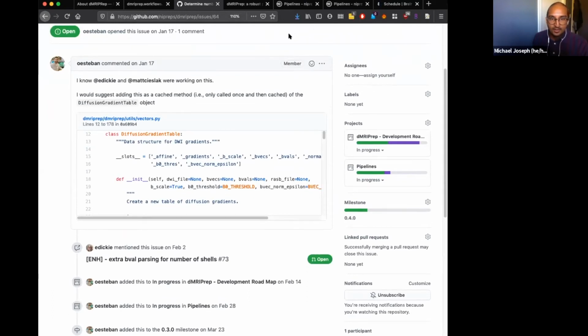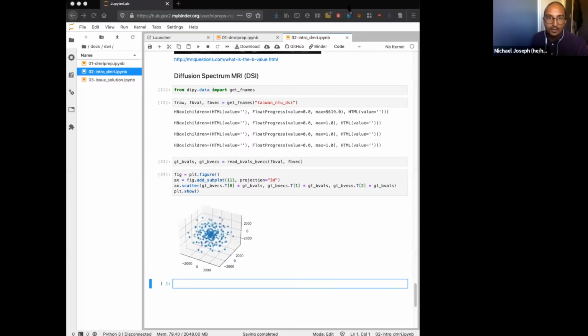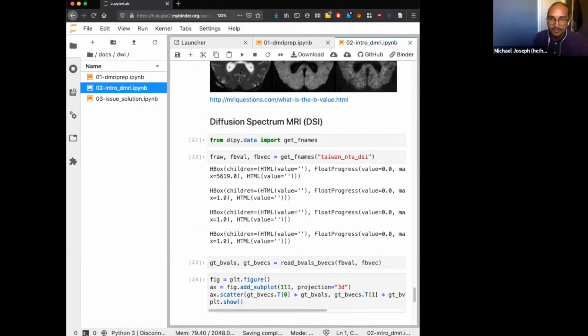So let's get started on creating a simple parser for that. I'm going to switch the screen that I share. One really simple way to do this is using the Counter package from collections. I'm just going to make the text a little bit bigger.